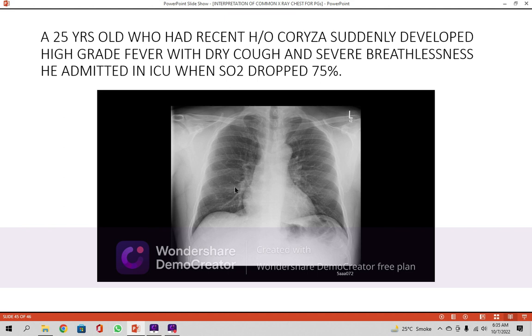The typical example we find is in cases of rheumatoid arthritis. There are a lot of variants in which these striations are at first fine and then become very coarse, and very coarse. So a reticulated appearance occurs and a fibrotic reaction occurs in the lung. The other disease is sarcoidosis, for example, with perihilar lymphadenopathy; if it is not exactly lymphadenopathy, then one variant is like this in sarcoidosis.